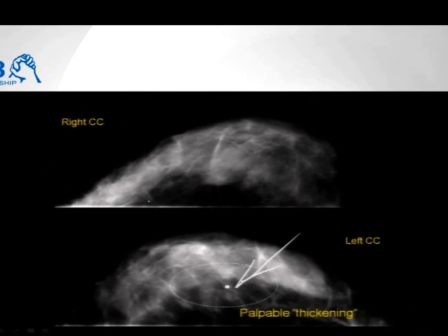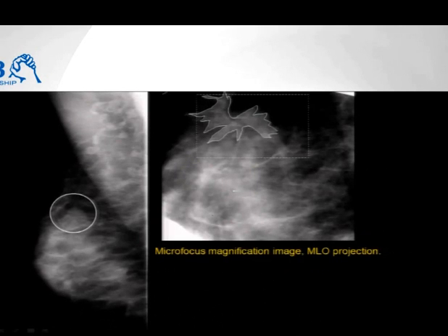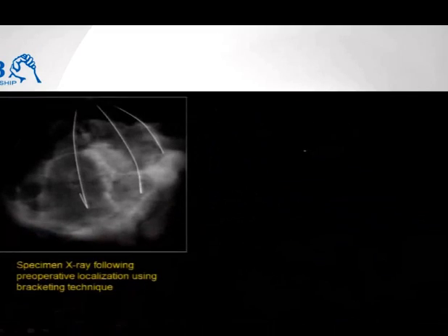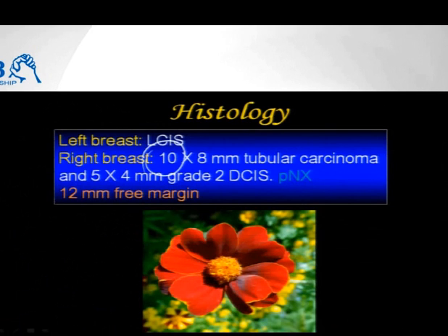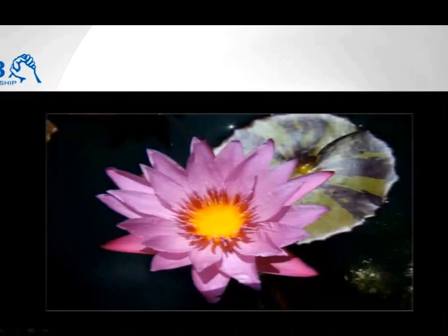Doctor, look here, look here. Yeah, but the cancer is here. On the no man's land. And after that, the rest is easy. Hand-eye coordination, either cytology or core biopsy, one shot. And this 41-year-old woman had a 10 millimeter tubular carcinoma. Her long-term survival probability is enormous. Her risk of dying from breast cancer is as low as her neighbors who never got breast cancer.